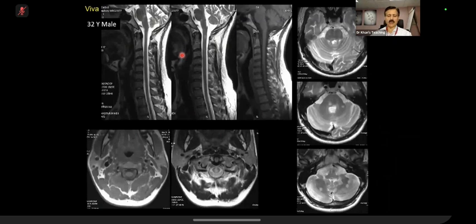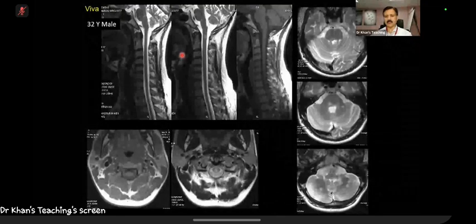Now you have to think differential diagnosis wise. When you see something in the cord, you have to ask for contrast. If there is a cystic component, think tumor, because demyelination, as in MS or ADEM, acute disseminated encephalomyelitis, should not have a cystic component, particularly at presentation time.